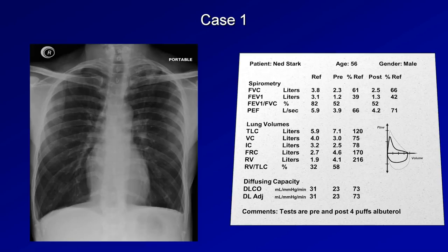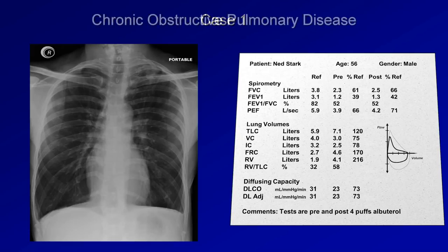If you haven't had much practice examining X-rays, you may not appreciate that these lungs are just a little bit blacker than normal, and the diaphragms are relatively flattened, consistent with the hyperinflation seen in the lung volumes from the PFTs. So in summary, the patient is a smoker with chronic respiratory symptoms, soft lung sounds on exam, PFTs consistent with obstructive lung disease, and a chest X-ray with hyperinflation. The diagnosis here is chronic obstructive lung disease, or COPD.